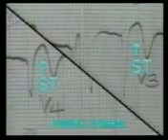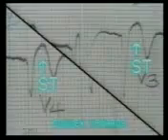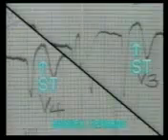This is ST segment elevation with inverted T wave. So the ST segment is convex upwards. This is the picture 1 to 2 days after an acute attack of myocardial infarction. It is important to note whether there is reciprocal ST depression in the opposite leads. That will confirm the diagnosis of infarction.